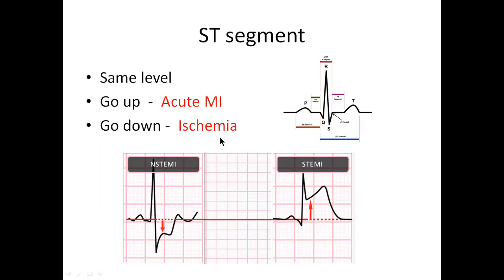But the ischemia may be so bad that it can kill a few heart cells, myocardial cells, and then we call it a non-ST elevation MI or non-STEMI. But it could just mean ischemia as well. See, it goes down.